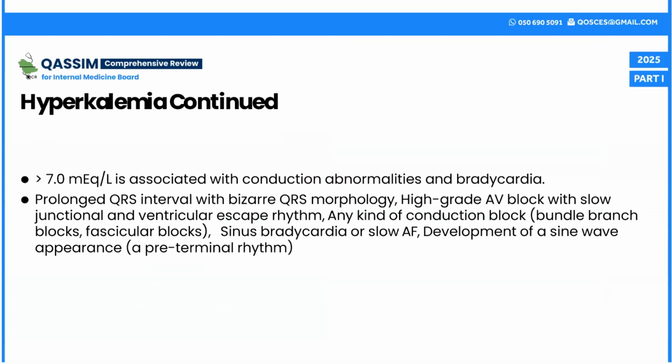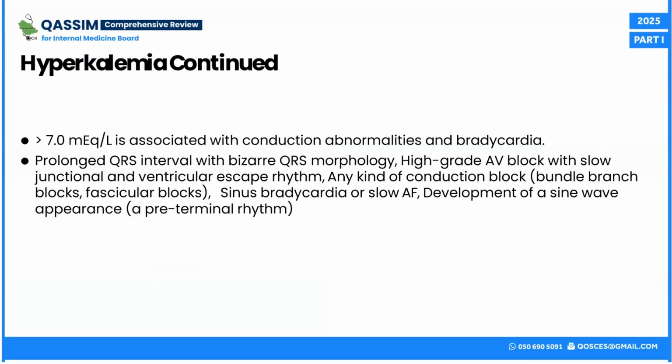A prolonged QRS interval with any bizarre complex, sinus brady. A sine wave is what we call a pre-terminal rhythm. Hyperkalemia is a joker of rhythm. It could present from a simple T wave to a PR segment elevation to a wide QRS complex to a prolonged QT to escape rhythm to a sine wave as a pre-terminal rhythm before arrest.